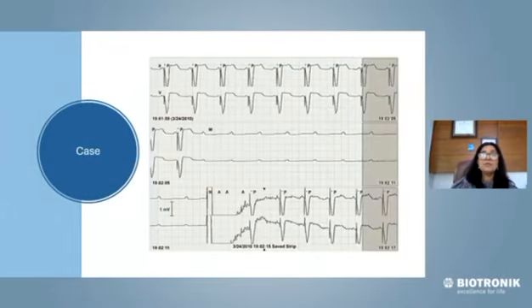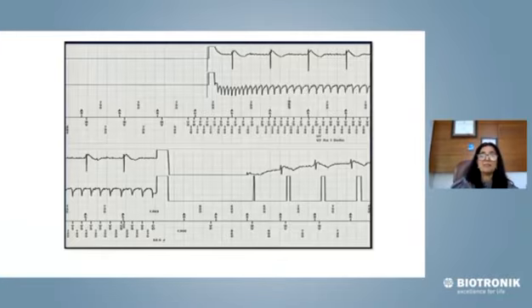You can see here the patient is having paced rhythm. There is A sense, V paced. You can clearly see suddenly something happens where there is just P waves and there is asystole. So for a short period of time, there is P waves, the patient is pacemaker dependent. So something happened. The device sensed that there is something happening in the ventricle that's called ventricular oversensing, which could have happened for many reasons. And we're trying to identify why did this happen.